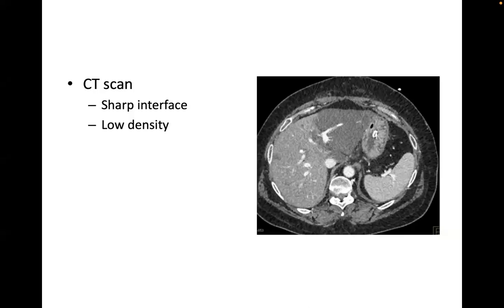But in cases where there was trauma or any surgery done, it might mean that there might have been injury to, for example, the hepatic artery, leading to hypoperfusion during contrast infusion. So that I think is clear. It's an example of that. You can see that we are on the arterial phase there. You can see the artery, and also you can see the IVC as well.